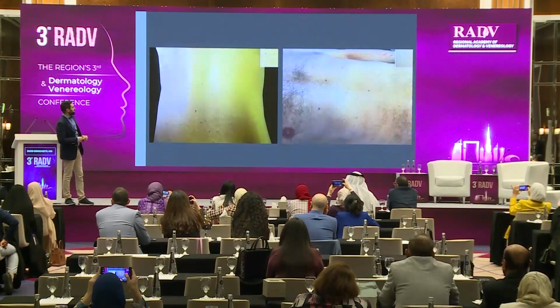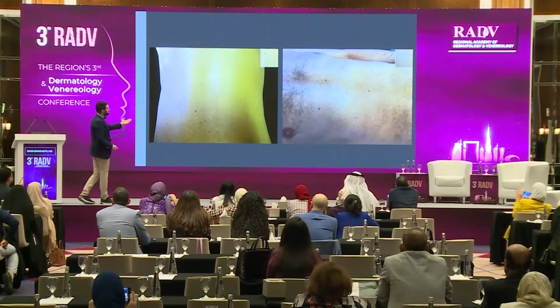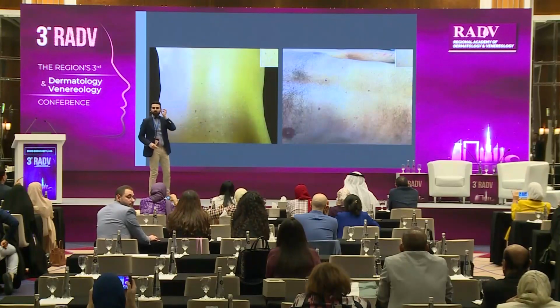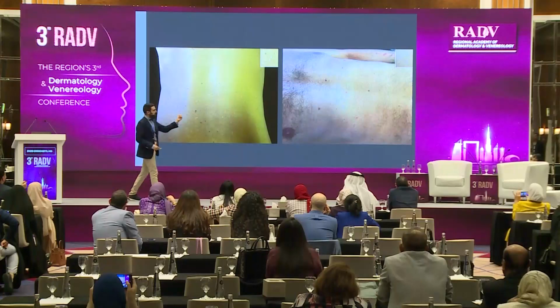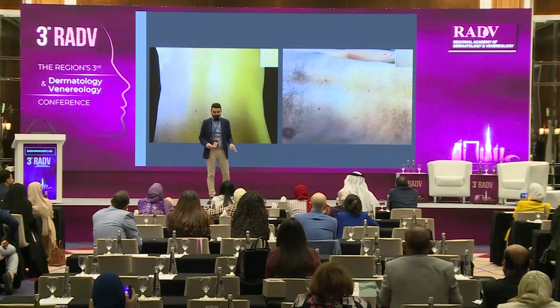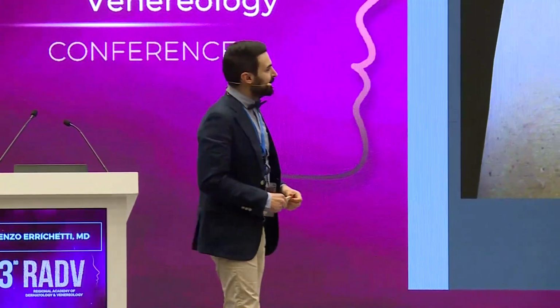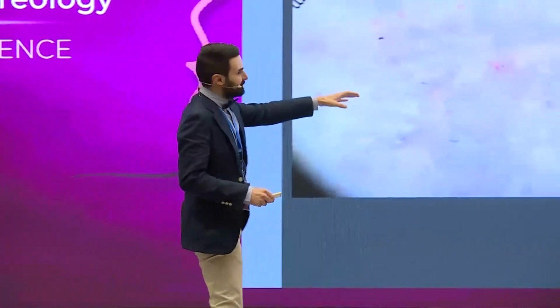Perfect. And here, idiopathic guttate hypomelanosis, which one? This one? No? And that one? Lichen sclerosus. Ah, it could be. Let's take a look at dermoscopy. So here we have perilesional pigmentation, so idiopathic guttate hypomelanosis.